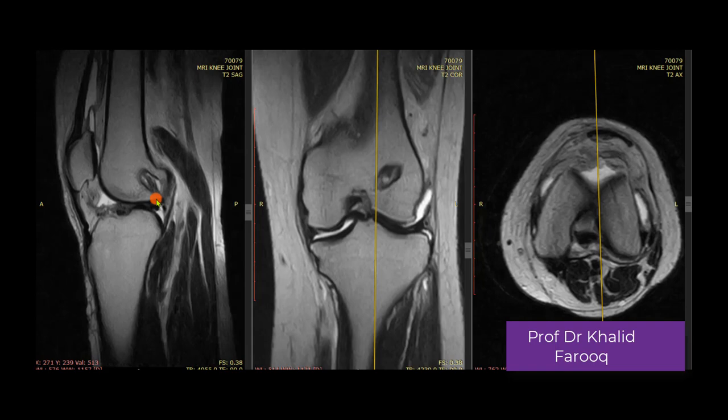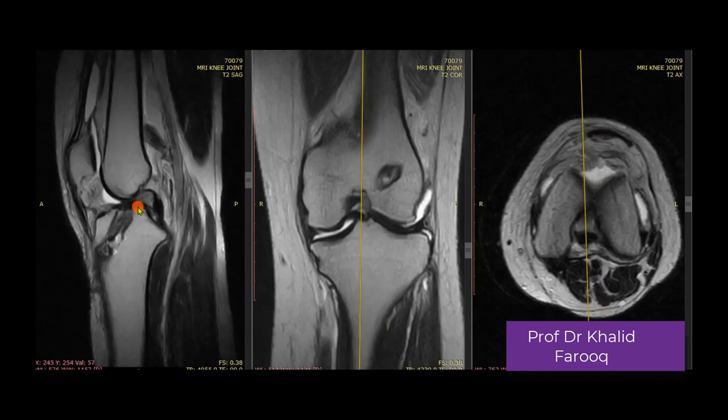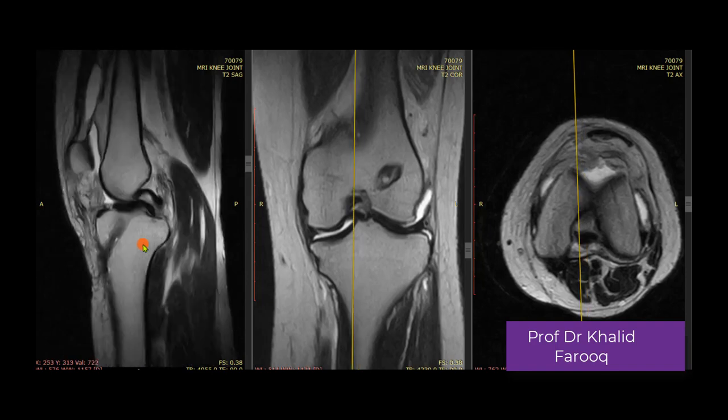This one is the upper portion or femoral attachment of the grafted ACL, while we could not find its mid and lower portion, suggesting a total graft failure.